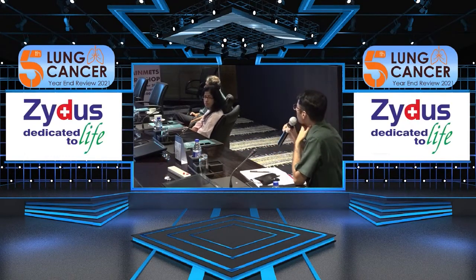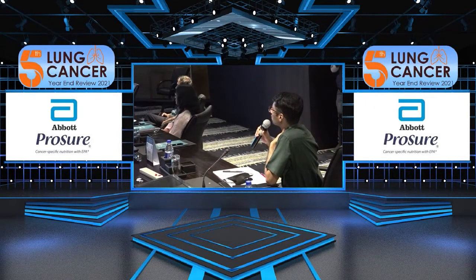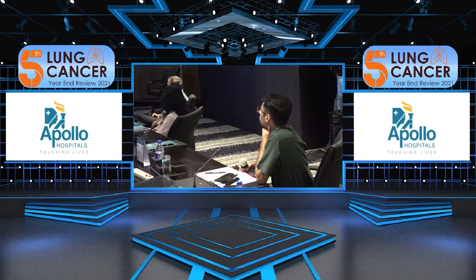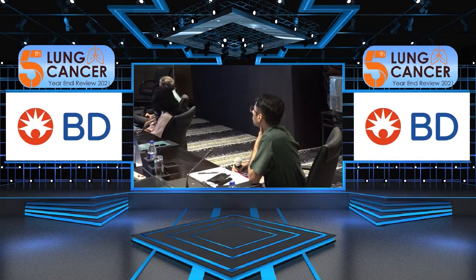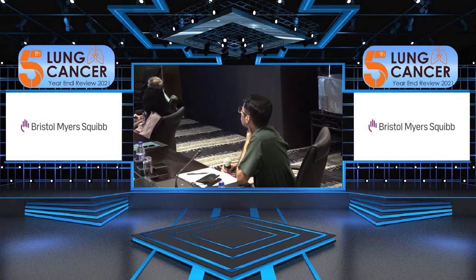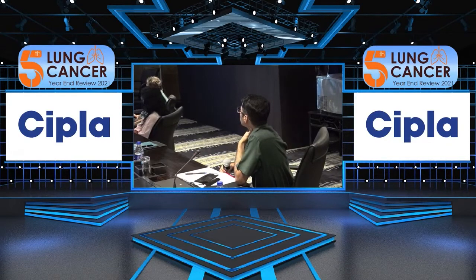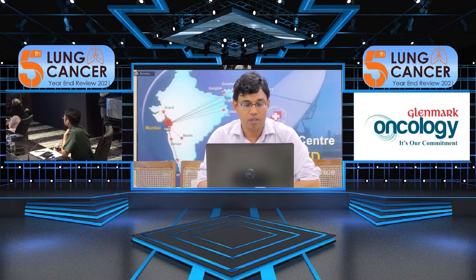So which sequences should we focus on, like if there are small metastases? Any particular sequences that we should focus on? So I will show you the sequences that are there. So this is the particular set of sequences. The most important is the T1 post-contrast images and FSPGR. This is the most important sequence, because you can convert it into something like CT. So it is a three-dimensional picture, and it will pick up small metastatic lesions, even around 1 or 2 millimeter size lesions. We are picking them up, and then when we are following them up, they will either increase or they will regress on the follow-up.